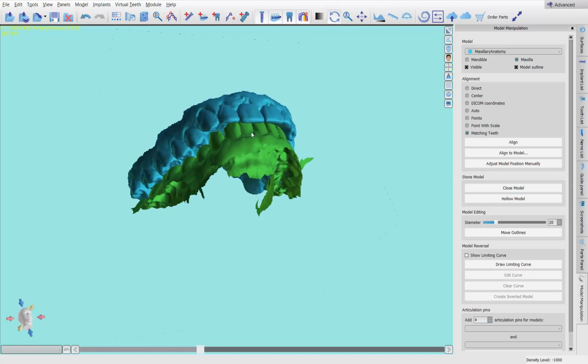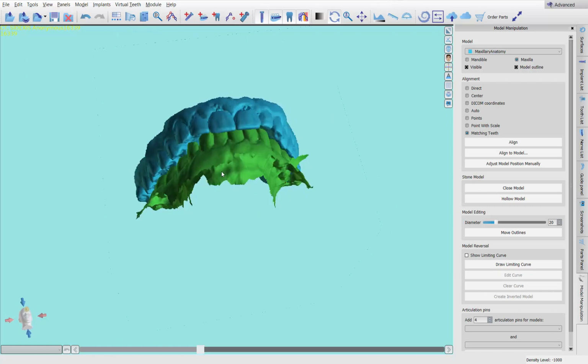Now, so that's the end of the video. That's the end of the technique. Okay, it's not the end of the video. It's the end of the technique. If that's all you want to know, fine. Now you know how to do it. But let me explain now why this works.